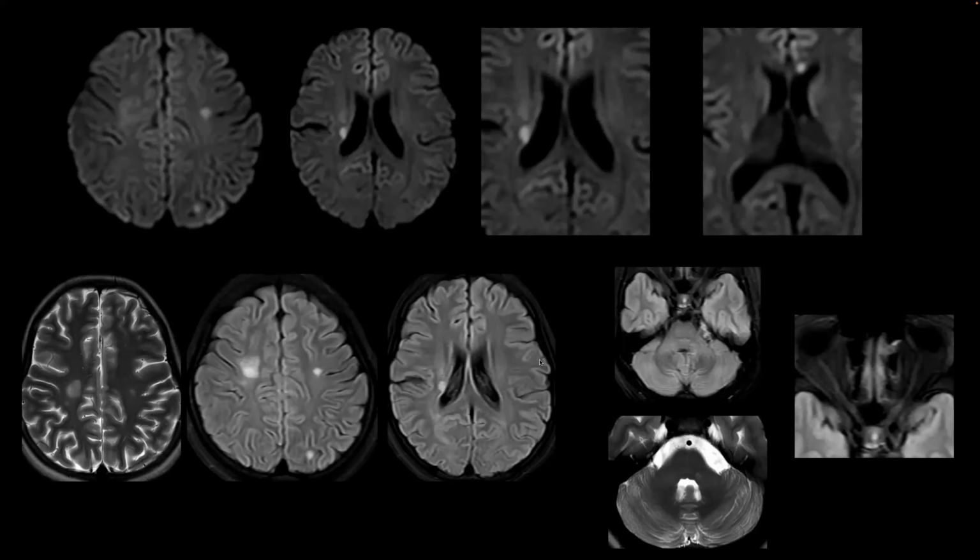On the T2 and FLAIR sequences, at least compared to the first scan, though we don't have the images of the interval scan, we have these abnormalities in the superficial or deep white matter on both sides, and also in the periventricular white matter. Coming down to the posterior fossa structures, the middle segment of the peduncles are slightly hyperintense on FLAIR and also on T2 sequences. This was not demonstrated on the initial scan.